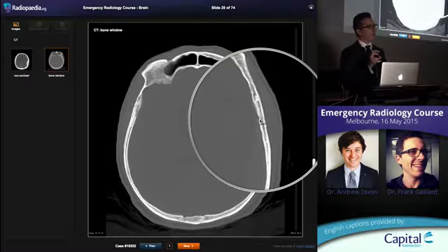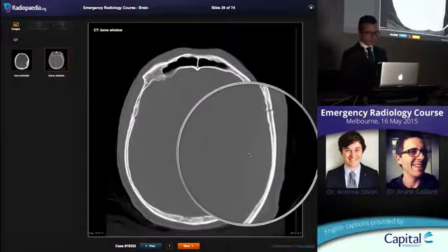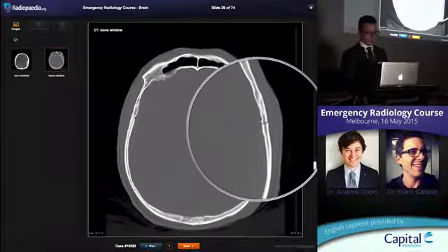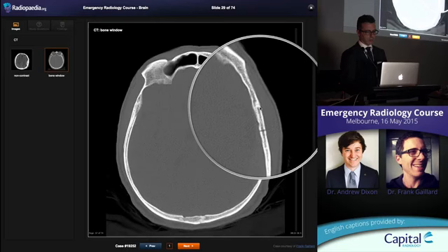It's arterial, it's under high pressure. Young patients will die quickly from this if they're not decompressed, but if you decompress it, the underlying brain is okay, and they do very well. And if we just look at this, you can see on bone window even where that hematoma is. It crosses the fracture, but here's the suture, and it's not going past that suture anteriorly.